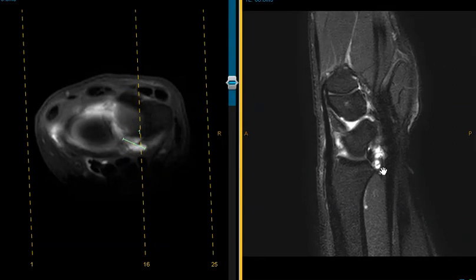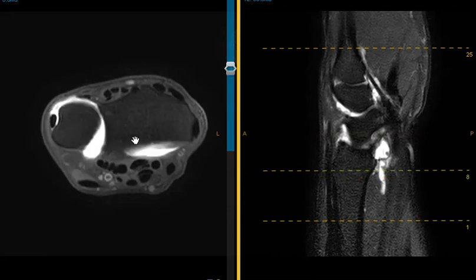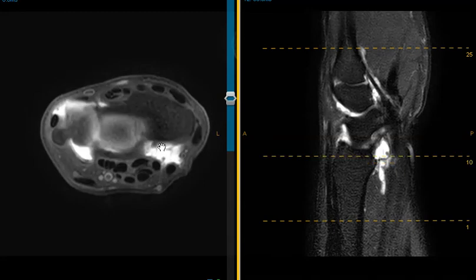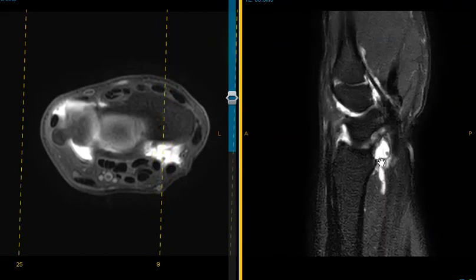Now one more patient, and this patient again has the arthrogram, so the fluid is very bright in the joint. As we go over the distal radius, here's the radius, and there's that little contrast collecting over the palmar distal radius, protruding outward. So it looks like when it's under pressure, especially with an arthrogram, that weakness allows the contrast to bulge outwards. We see it here bulging outwards, and some of it may even have extravasated down here. So again, this looks like a defect that we've seen in almost half the patients, and more evident when they've had an arthrogram to have the joint capsule protrude outwards.